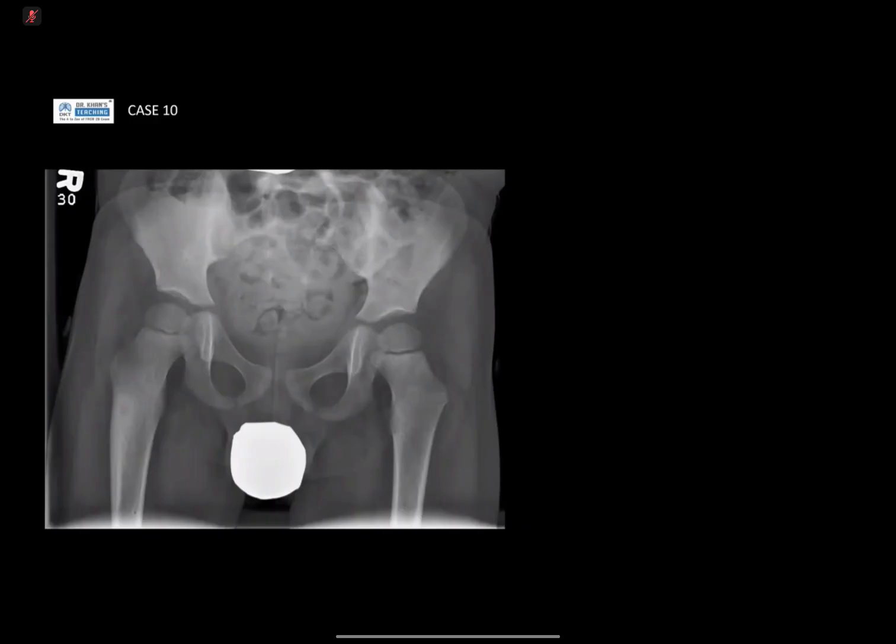Candidate 2. So I'm given a frontal radiograph of the pelvis of a skeletally immature patient with a gonadal shield on. I can see fairly defined sclerosis in the right proximal metadiaphyseal region of the eccentric cortex, and some lucency in the neck of the right femur towards the trochanter.